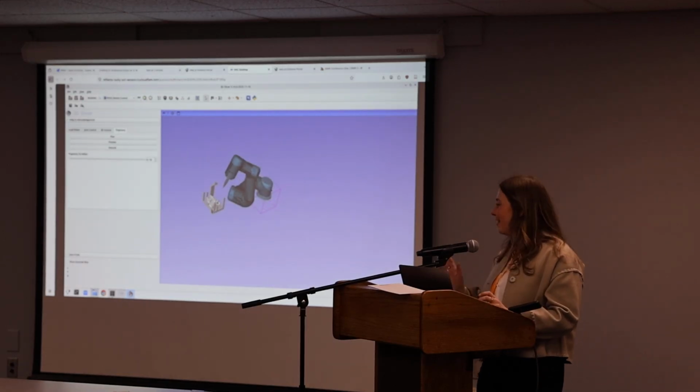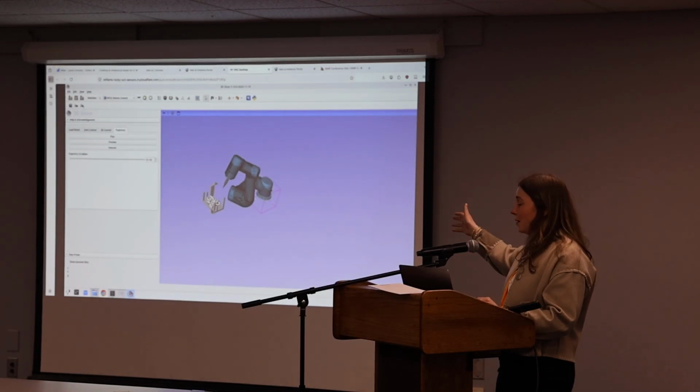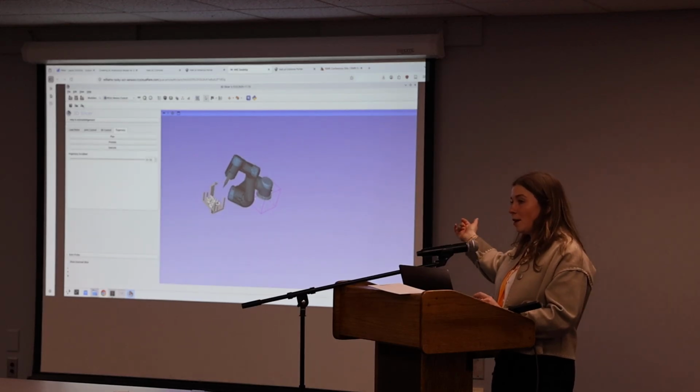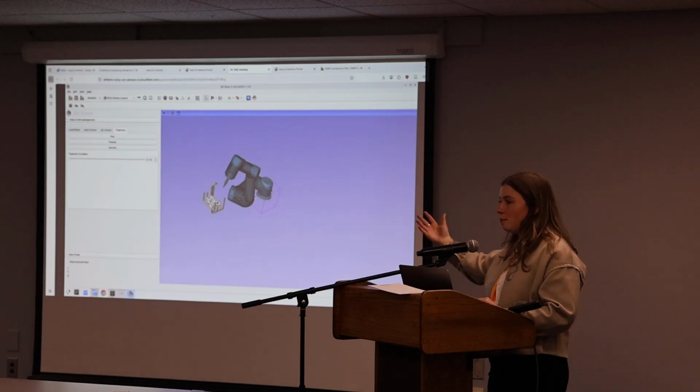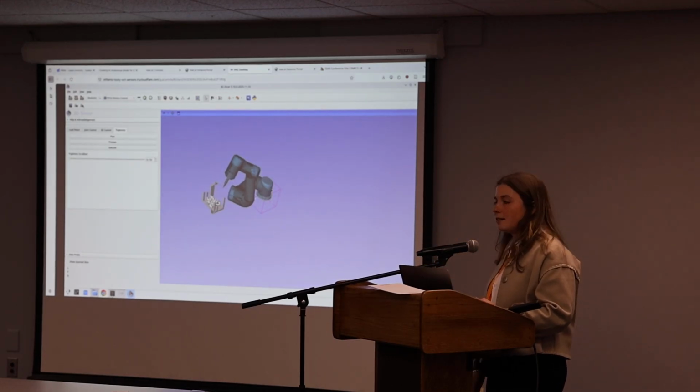The high level of what we wanted to show is, if you had a real registration and you had points that you could somehow track on your anatomy, now you have a nice means to plan a trajectory based on that, preview it and execute it with whatever planning tool that you're using in Slicer.